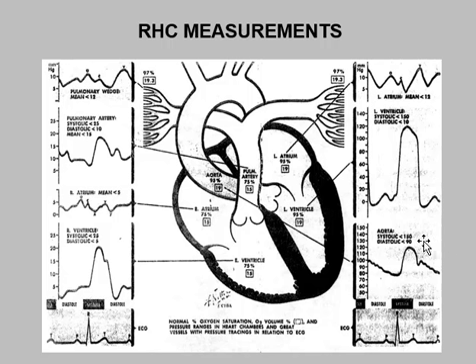I won't go over it again, but you can see your chambers and you can understand how the Swan-Ganz catheter is recording this pressure from the right atrium, this pressure from the right ventricle, that pressure in the pulmonary artery here, and that wedge pressure. If you advance the catheter right up to the tip, you generate this A and V wave complex.